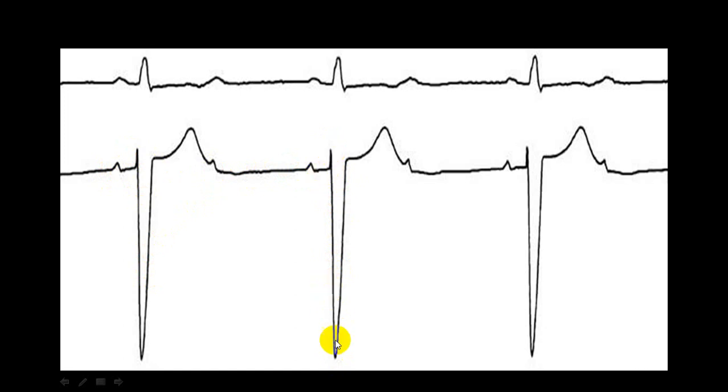And this is a ventricular premature. This is a ventricular complex. So we can say that there is no relation of QRS complex to P wave. Either this is a complete heart block or this can be 2:1 AV block with intraventricular conduction defect. So this you will be able to differentiate by doing an EP study.